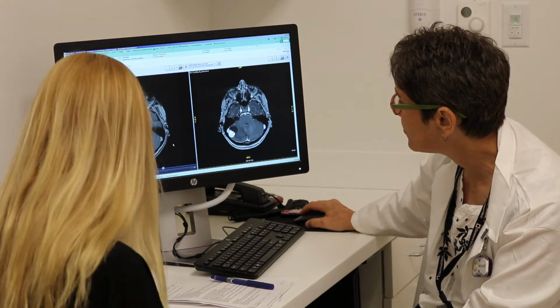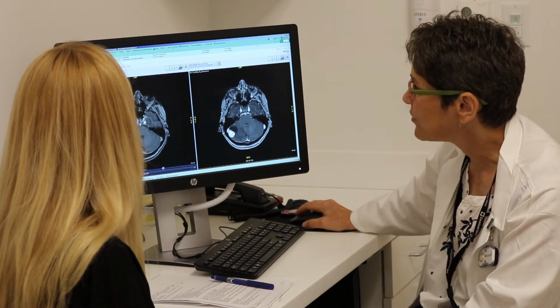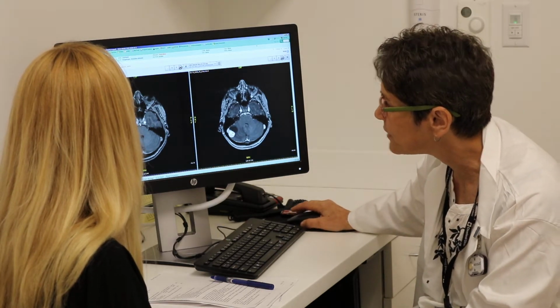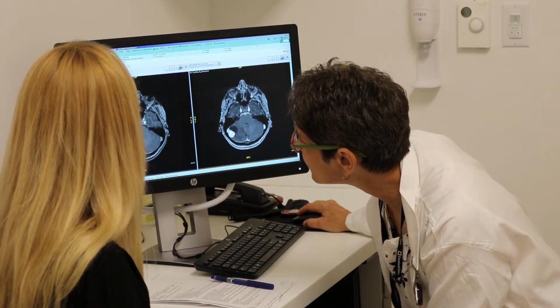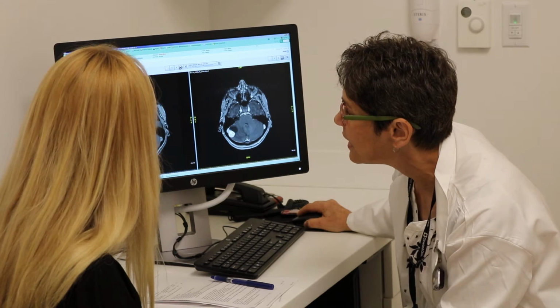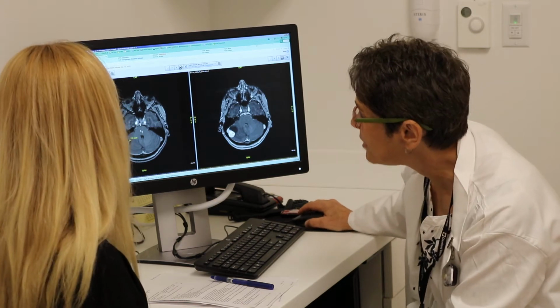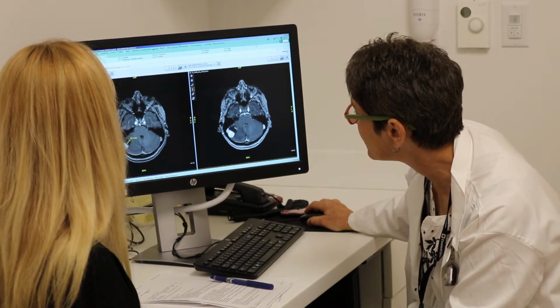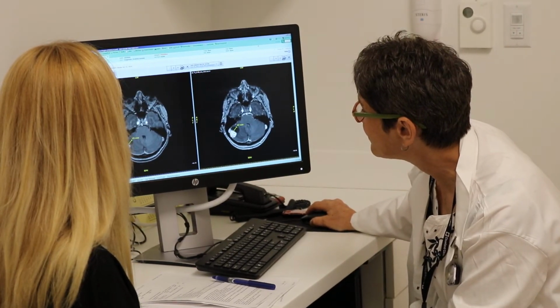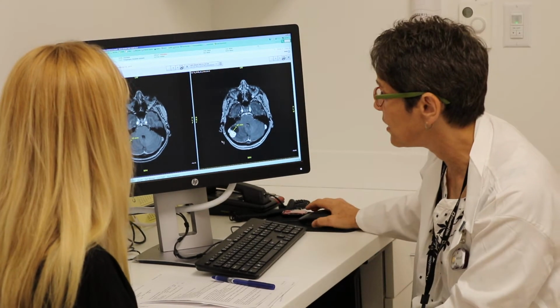This is pretty close to the same one. So if I take the measuring tool out and I measure the whole diameter. That's the tumor or the tumor's cyst? The cyst is the dark component. Okay. And the tumor is white, the enhancing area. Okay. So I'm measuring this, maybe 26. I kind of caught it a little bit short on that one. So, a couple millimeters bigger counting both the cyst and the tumor there.